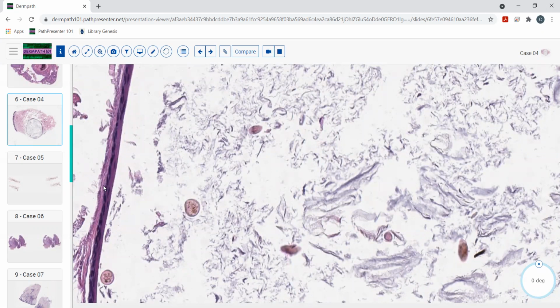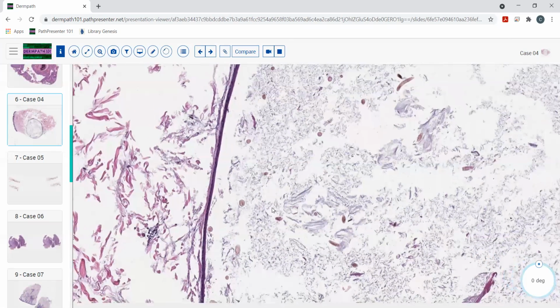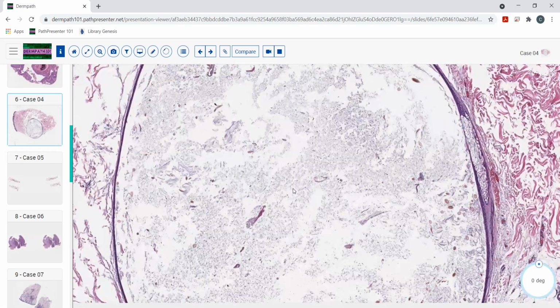So key to this diagnosis: thin wall, 2 or 3 cell layers, no corrugated lining, may or may not have a sebaceous lobule in the wall. I'd say most of the time no, and all of these vellus hair shafts in there with these squames that would be sort of analogous to sebum in a way. And these can occur in an eruptive fashion, and they can kind of look like steatocystoma multiplex. You get lots of lesions on the chest area, for example.